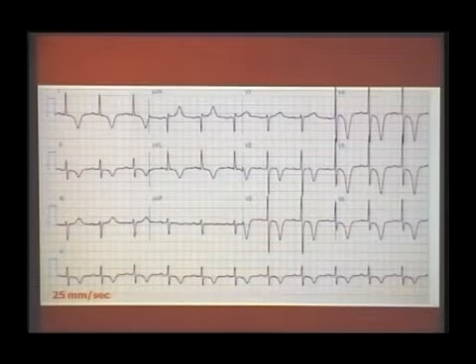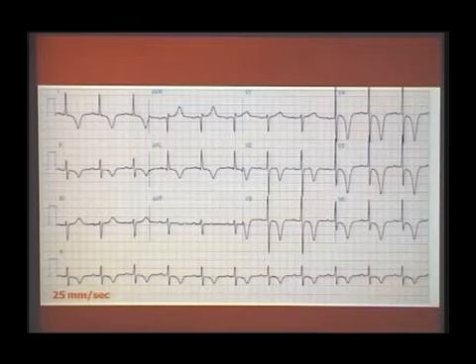So this ECG, you have seen or not seen? Yes, this is one of the MCQs we told you, whether T wave direction is normal or abnormal. Here the T wave is abnormal because of the direction. QRS is upright, but the T wave is negative. That's why here the T wave is abnormal because of the direction.